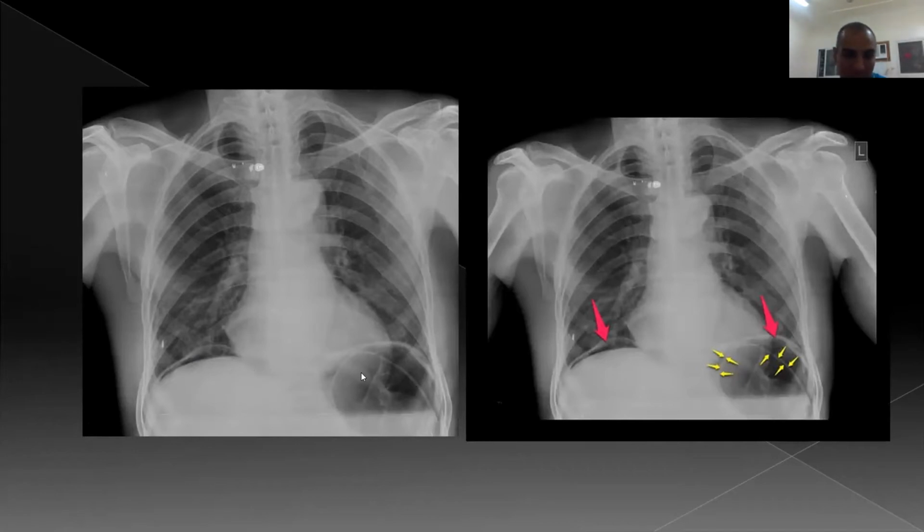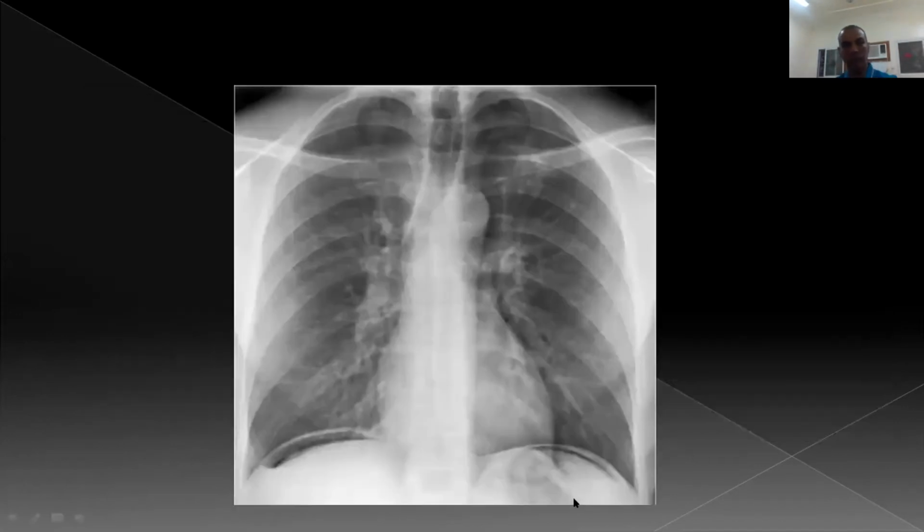Don't misdiagnose: this one is inside the bowel, but this lucency is outside the bowel. It's clearly between the diaphragmatic copula and the hepatic shadow. This is also a classic case of subphrenic gas or pneumoperitoneum, here and here.